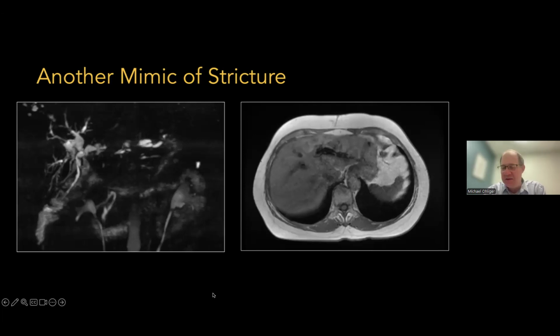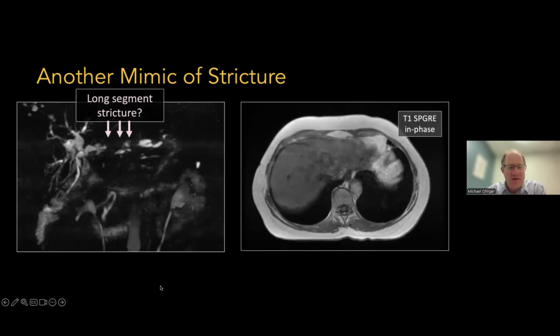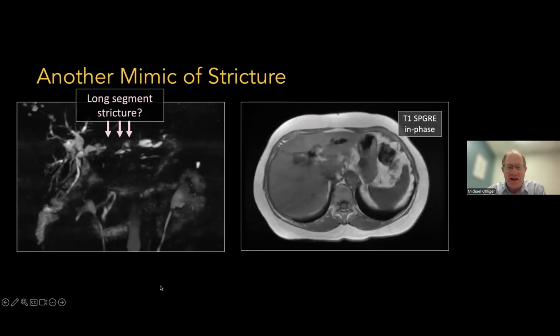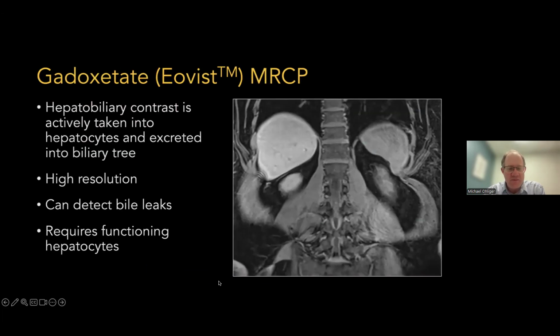And so, again, that's something you all need to know, but I think it's really a nice example of how these things can be a little bit more complicated than they look at first. That can be tricky. So again, this is air in the biliary tree, and then looking like a pneumobilia sphincterotomy.